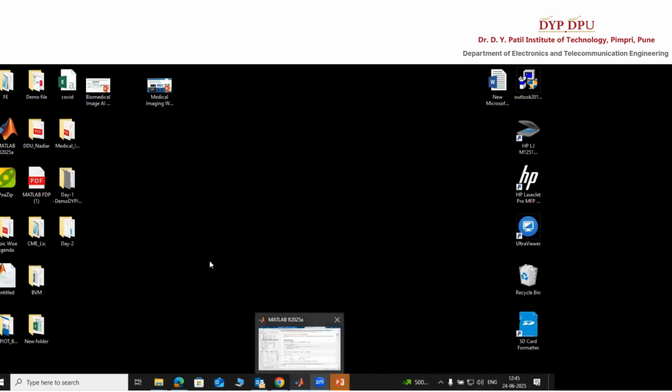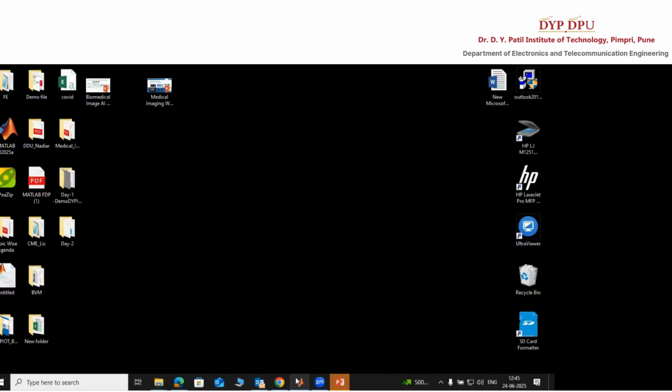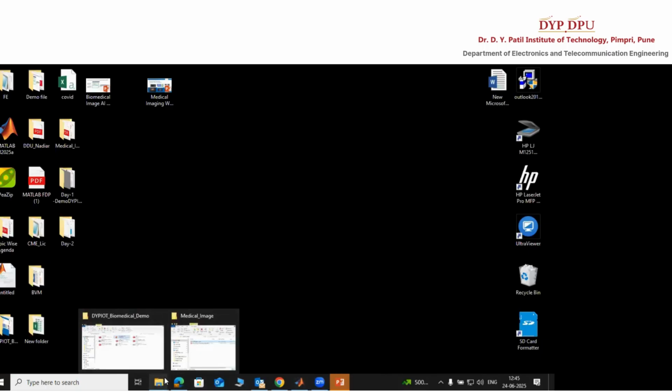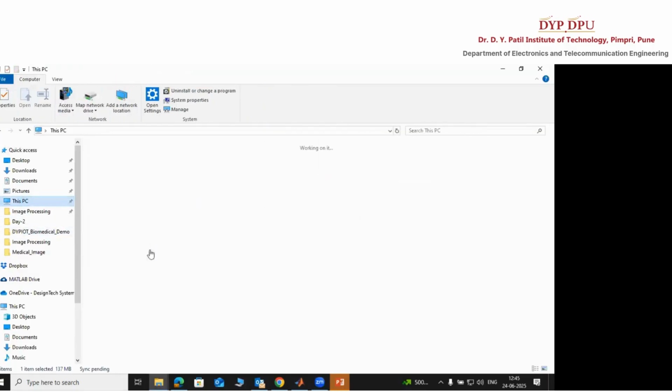Now I will show you quickly how to use the AI, where the resources are available, and all the things. I have already shared the code with you. So in MATLAB, I have given the codes here.